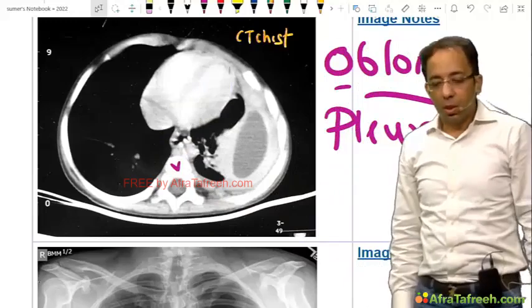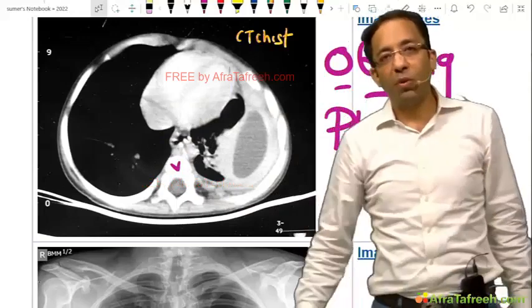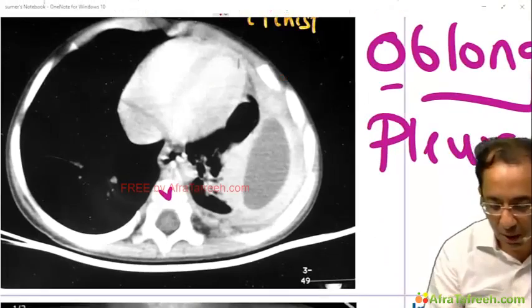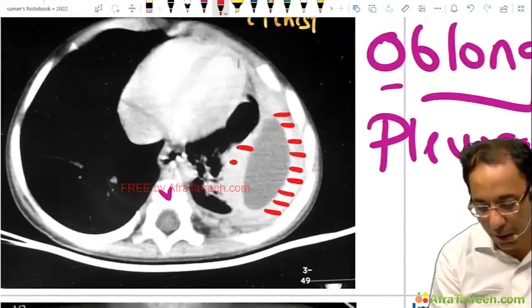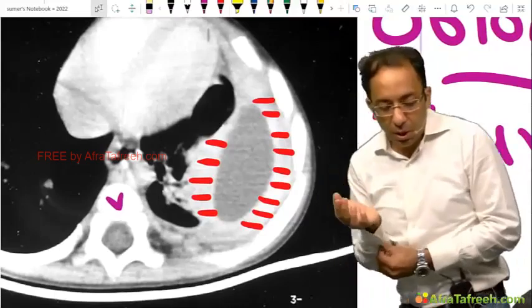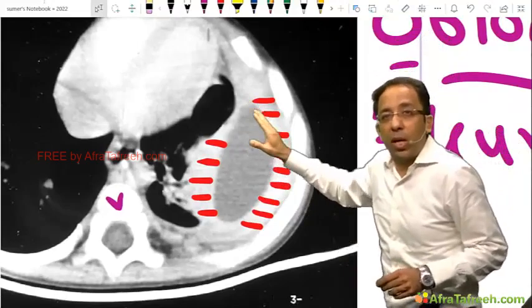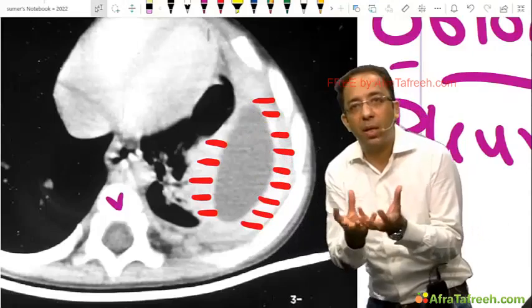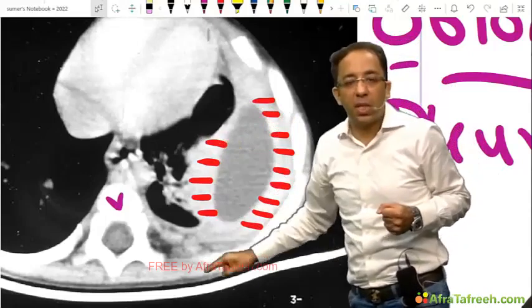My question to you, all of you listen to me. Once you understand, you will win the game. But you have to understand once, my friend. Please, everybody see with me. This is your parietal pleura. This is your visceral pleura. Everybody, listen to me and answer. The pleural layers are thickened and they are also white, they are picking up the dye. So there is increased vascularity in the pleura and the pleura is thickened.